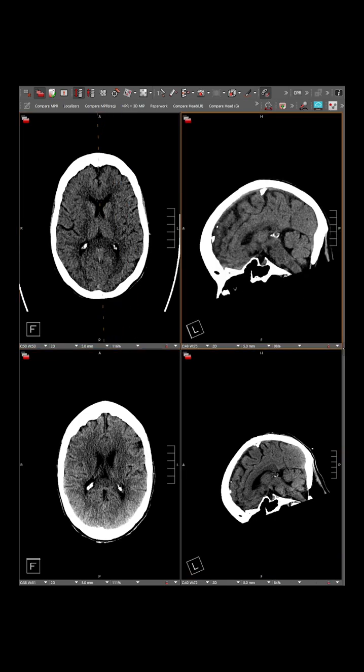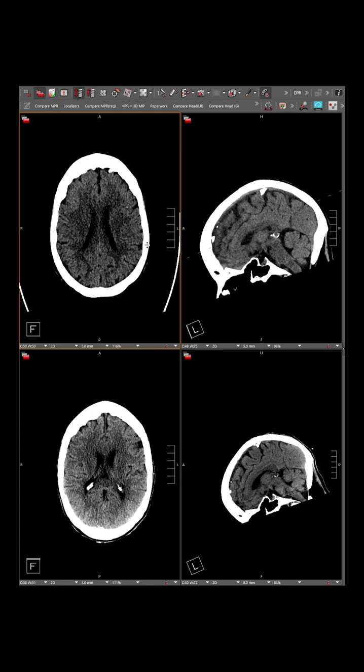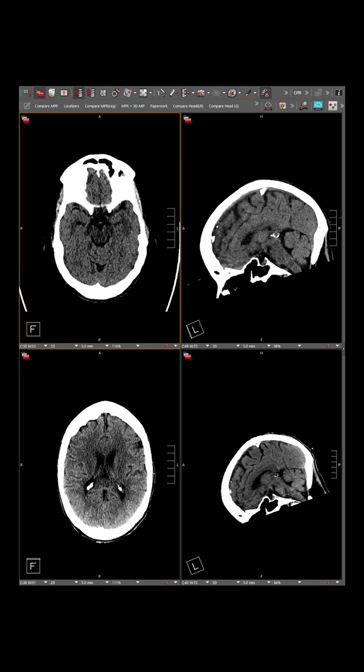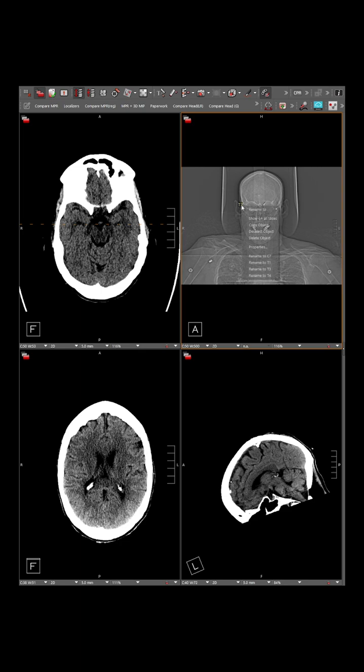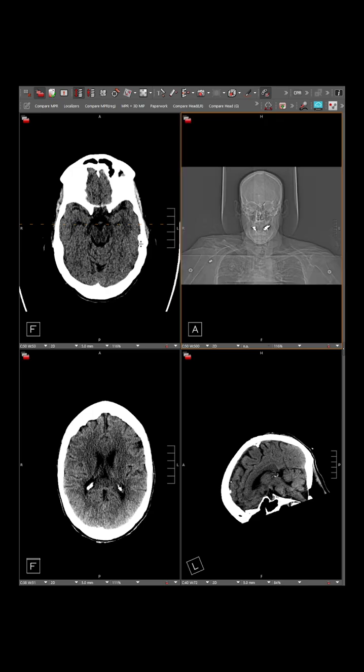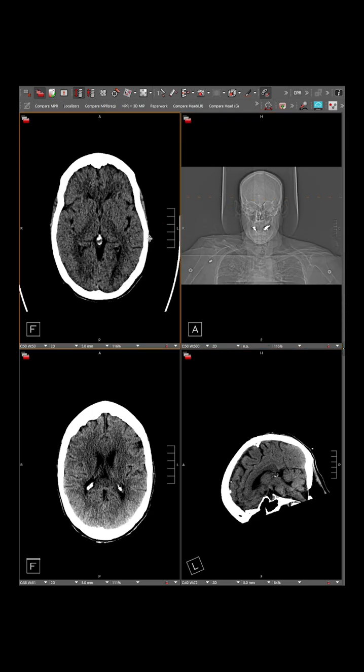And a couple less commonly used tools. I mean, I've got CT, but up here. But if we were to bring up the localizers, oops, let's get rid of that as well. You could invert with I. If you ever need to draw an angle, G, I believe, is the default. Okay, so you'll need that in certain applications, particularly in pediatrics.